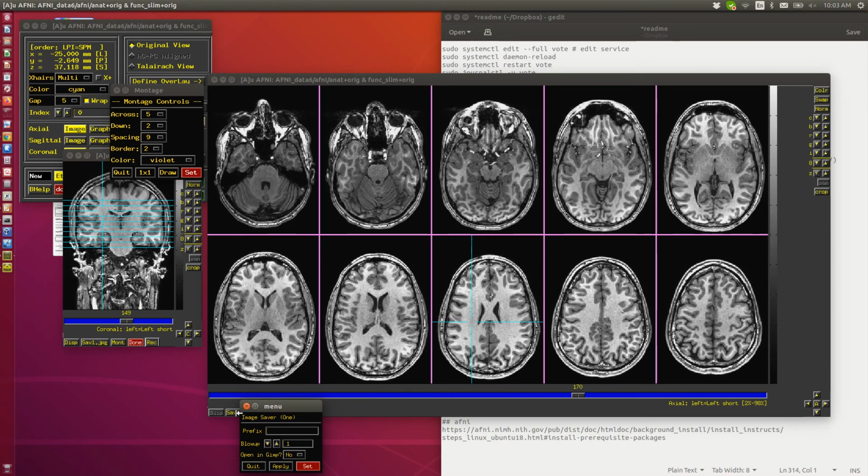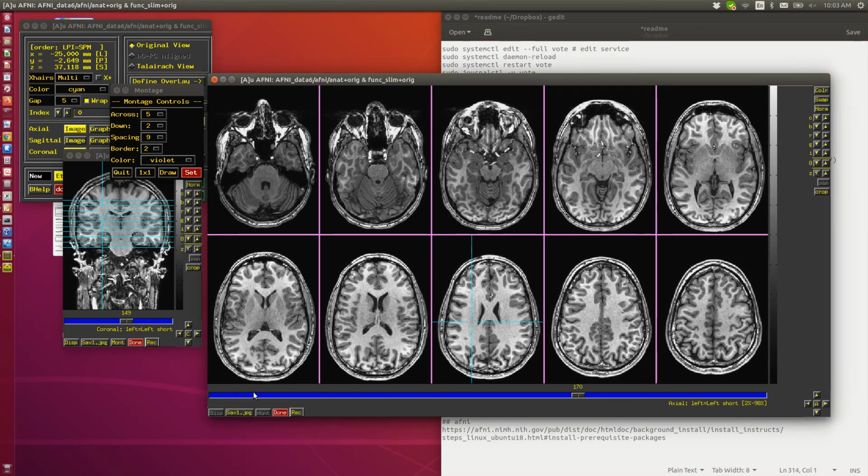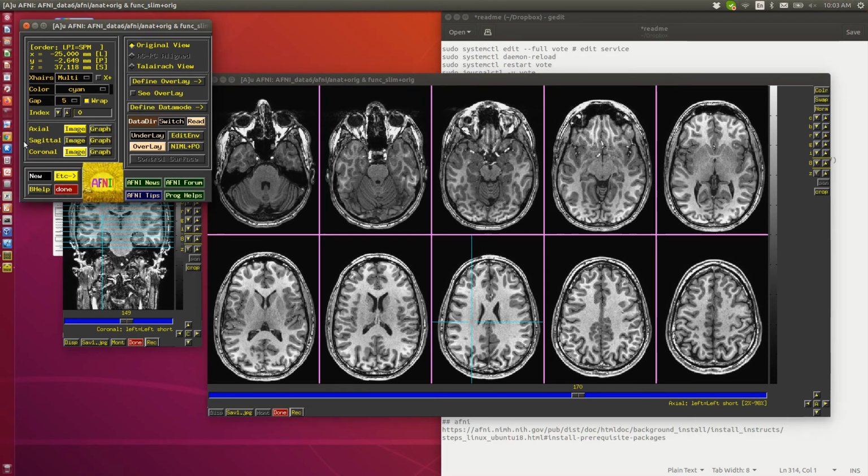And the crosshairs, I do this all the time. I save the image, open it up to make sure it's what I want, and then I see the crosshairs and go, what an idiot, pow! And then I save it again, so I'm just telling you that you have to turn the crosshairs off almost all the time. Some people like the crosshairs if they're going to discuss it in the figure caption, which of course your Christmas card always has, right? I mean, figure captions for your Christmas card. So we click here to turn the crosshairs off.